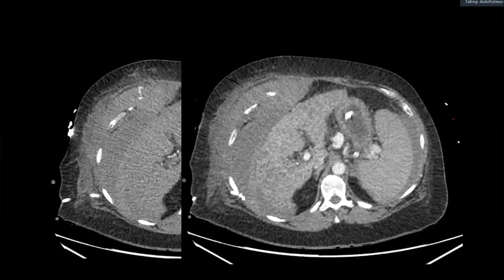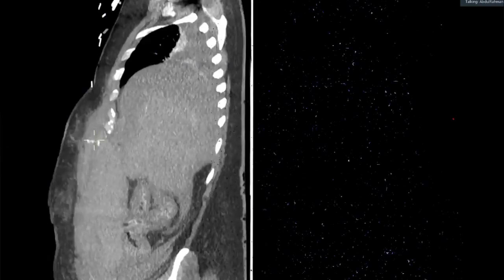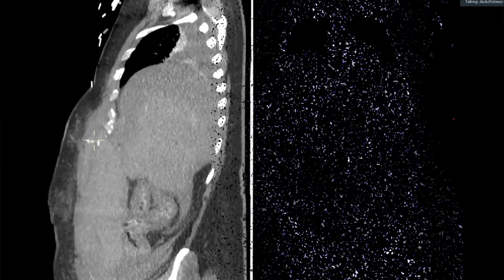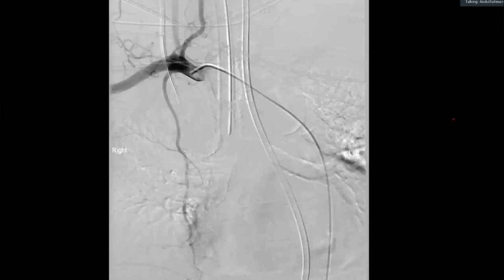So this is what then? This patient has active arterial bleeding, from the radiofrequency ablation. Good. So then interventional radiology was woken up, and you can see this hematoma that squashed the liver. This is the bleed here. The patient's not bleeding from inside the liver. They're bleeding somewhere else, within the abdominal wall. Yes.